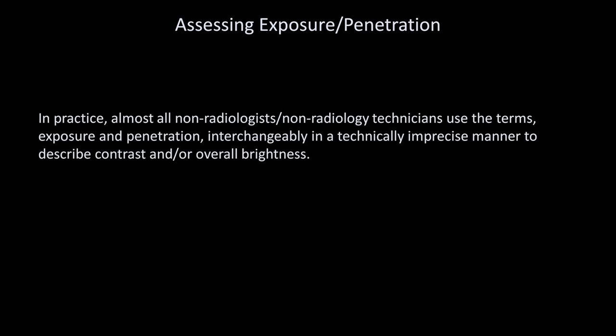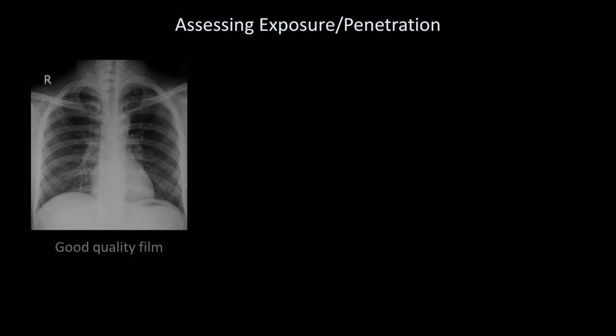When it comes to assessing a film's exposure, in practice, almost all people who are neither radiologists nor radiology technicians use the terms exposure and penetration interchangeably in a technically imprecise manner to describe a film's contrast and/or overall brightness. Here's a good quality film where the specific combination of brightness and contrast allow for the best balance of identifying various types of chest pathology.